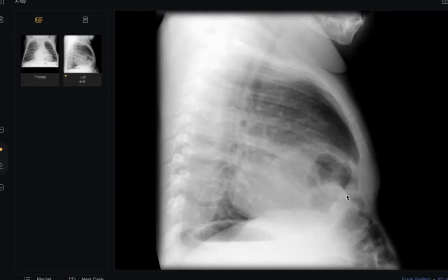Could you judge from the lateral, is this herniation right or left? Sir, this herniation is communicating with the colon, which is showing haustration. Doctor, listen to me. We have right and left. What is the clue?